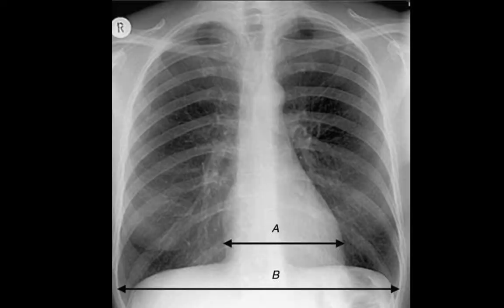Okay, sometimes we say that the heart is enlarged. The heart is quite a common thing to look at, and this is not the correct style of measurement of the distance of the heart, because as you see in textbooks, there should be a straight line, and then from the tip of the highest bulging point of the right heart border there should be another line, and from the highest tip of the left heart bulging border there should be another horizontal line.